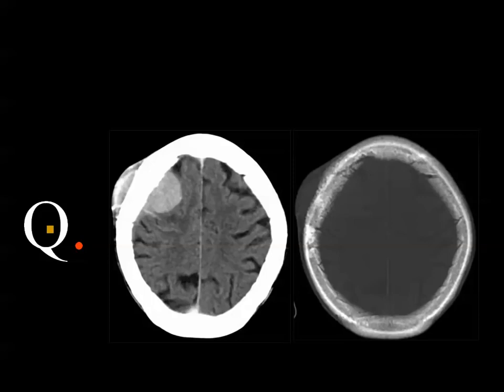Hematoma, you mean hematoma? No, no, the CT, but you are thinking of hemangiopericytoma, which is considered the aggressive one, or meningioma. Hemangiopericytoma. Based on what? Hemangiopericytoma is a big lesion that destroys bone. It is associated with bone destruction.